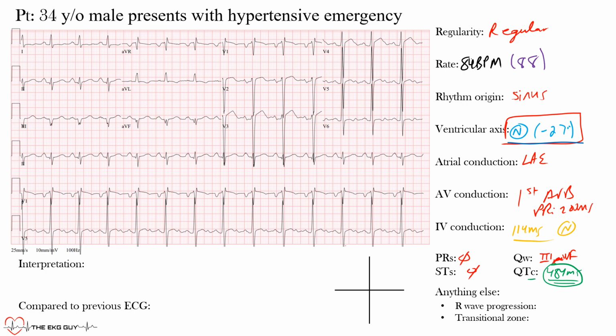And the Cornell criteria looks at the R wave in AVL, and it adds it to the S wave in V3. In male and female it is different. In men, greater than 28 millimeters, which we have a male patient, so that's it there. In females, it's actually greater than 20. So let's look at this here. The R wave in AVL and the S wave in V3.